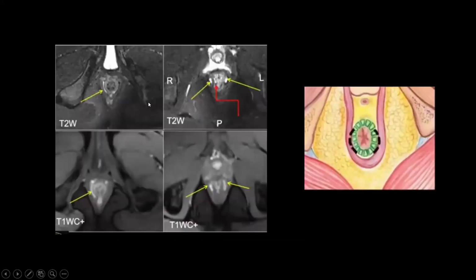Sorry. Yeah. So you've got again one more fistula lying in the intersphincteric space, right? The internal sphincter, the external sphincter, right? You go ahead and see there are actually two fistulas, both of them lie in the intersphincteric space. There's an internal opening here, the red arrow, right? And then both of them are on the sides, but they do not communicate with each other. They are not making a horseshoe, but both of these are simple intersphincteric fistulas.